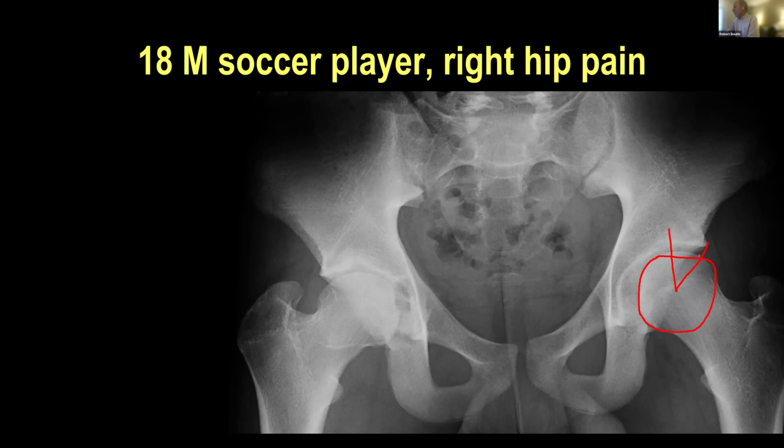This patient probably has a little bit of a crossover sign, although you have to be careful about calling acetabular retroversion based on whether they're rotated and different positioning things that I won't get into. But essentially, it's this angle that we're looking at for being between 25 and 39.